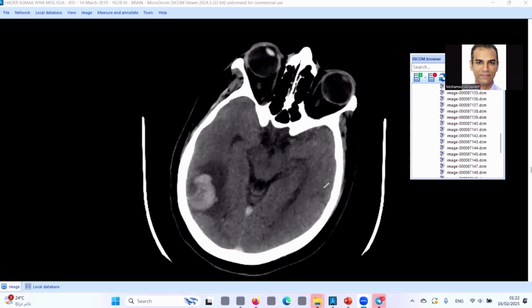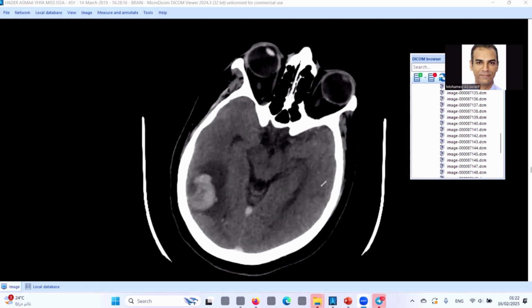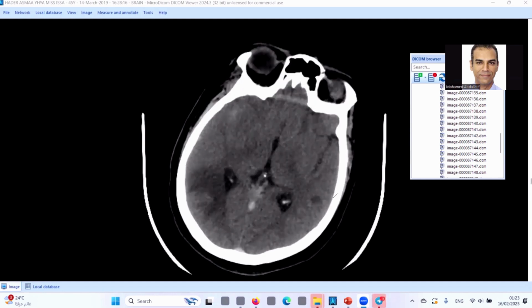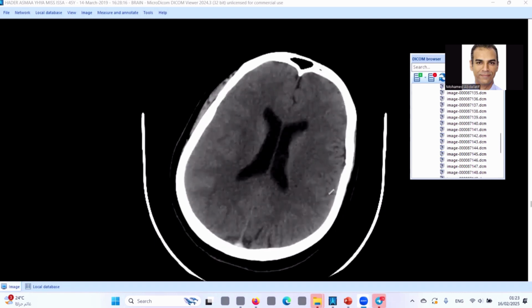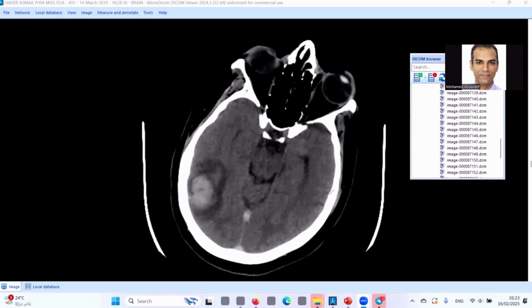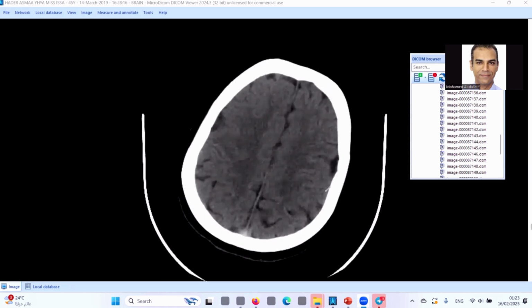There is no history of trauma. So how can we think again? Do we have the possibility of cerebral amyloid angiopathy that can induce intracerebral hematoma, peripheral intracerebral hematoma, and subarachnoid hemorrhage? It's very difficult because this is a young patient and the subarachnoid hemorrhage is away from this intracerebral hematoma. So let us go with our checklist. Once we have any challenging case like this, go by your checklist. You may find an extra finding that may explain the abnormality.